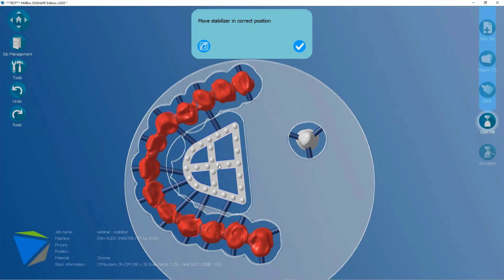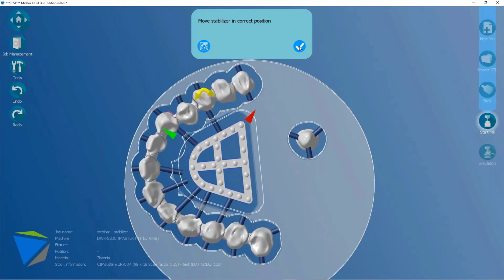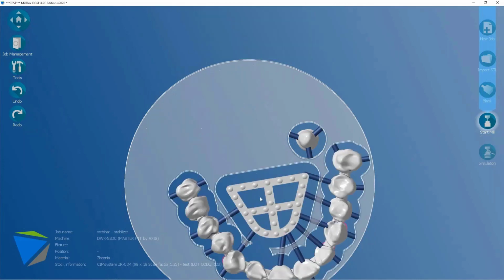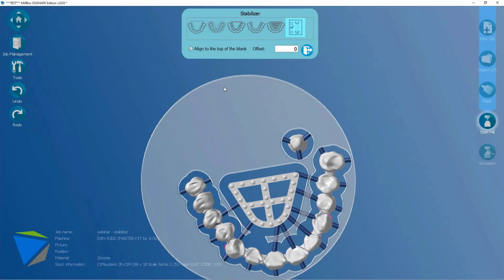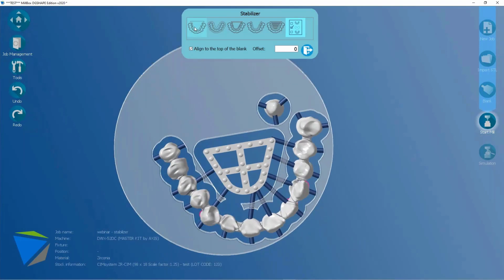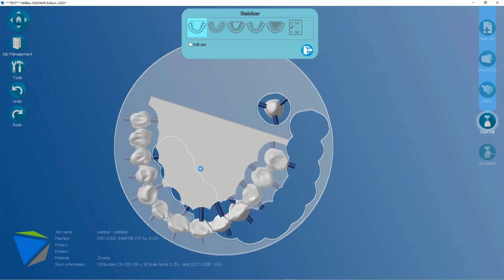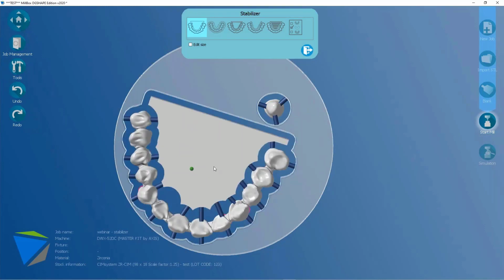Okay, so this one is not so good, but however, this is the way how to use it. Automatically, of course, all the connectors are placed, or in case you don't like it, of course, just click again and come back to other different bars, the one that you wanted, for example.